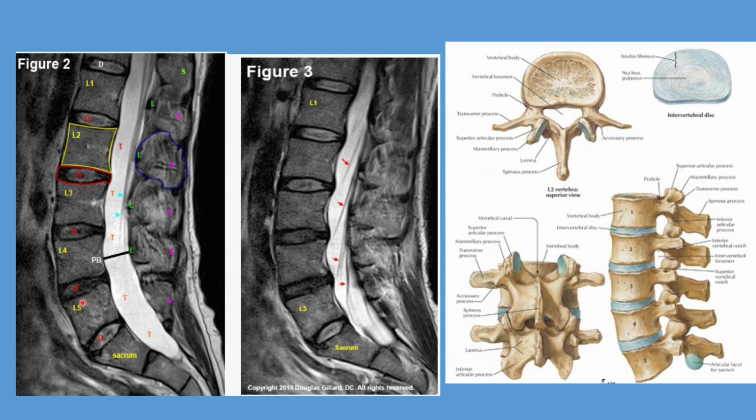So here you can see these blocks are your vertebra, which is your L5, L4, L3, L2, and L1. And the one which is highlighted in red here, that's your disc. And then you can see the spinal canal here. You can see the nerve roots. Usually the spinal cord ends at the lower border of T12 or L1. And then you have the cauda equina rootlets coming down. And this is your mid-sagittal cut on your left side. And figure 3 is your parasagittal cut, where you can even see the nerve rootlets of the cauda equina coming anteriorly to exit near the neuroforamen there.